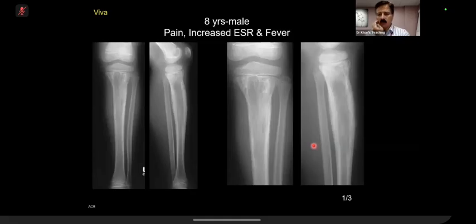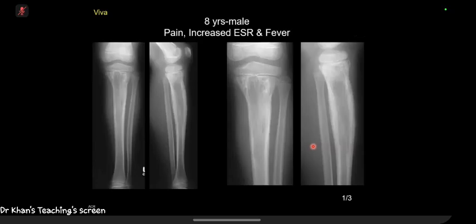So I'm cutting you because of the time factor. Aggressive lesion, and I'm concerned, with a fever, about osteomyelitis, Brodie's abscess, septic process. I would call it an MR. Okay, I don't have an MR, but I just want to ask you the differential. So you have talked about an aggressive process, absolutely fine. Infection, absolutely fine. What else? So since it's ESR, pain, fever, okay, so it can be a malignancy such as osteosarcoma or Ewing's, Langerhans cell histiocytosis.